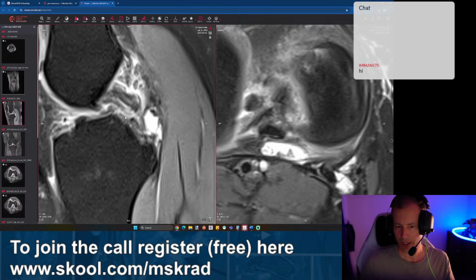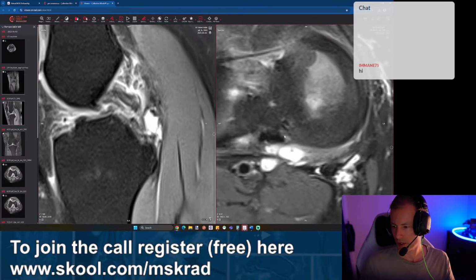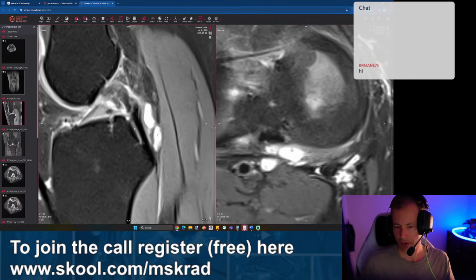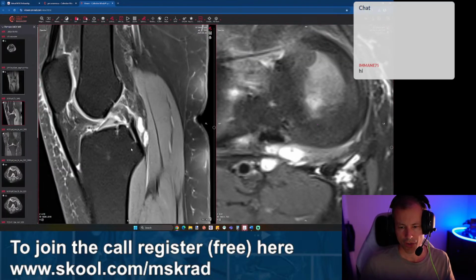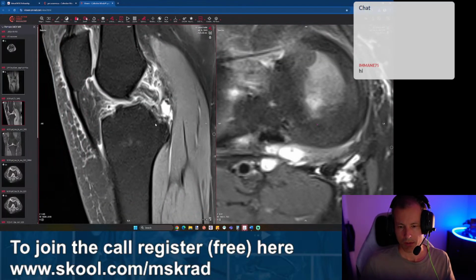So we see a lot of this high edema tissue here in the pericruciate fat bed anterior to the PCL, and the root would be a bit deeper, so it's somewhere in this level here, just going in front of the PCL or close to it. So we see the PCL here. So this would be the area of the root. So I would be going with some degeneration and fraying. There can still be some small micro tears that we cannot really appreciate now on these images.